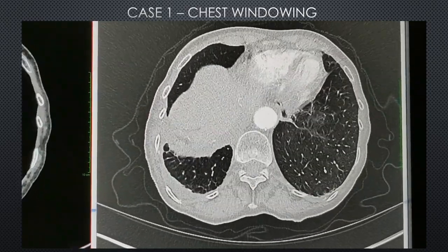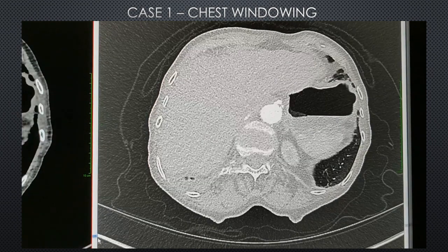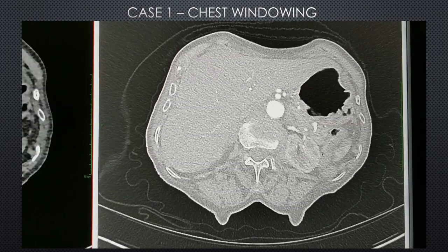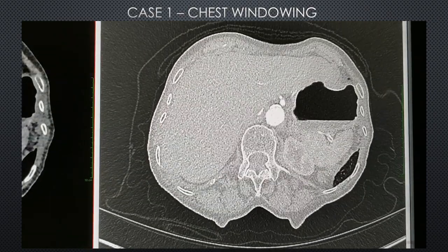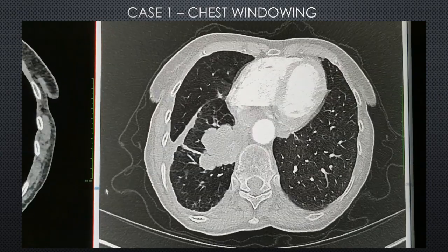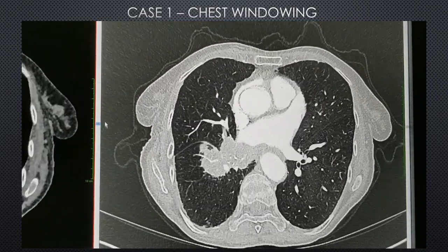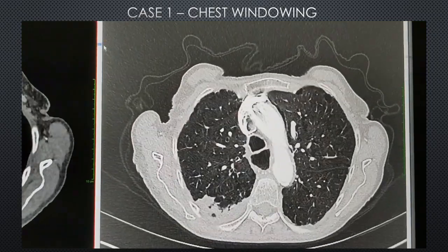This is the liver with contrast within it. That's normal looking. And then we're going back, and you can see the heart, so all the contrast within the heart is shown here, and the pulmonary trunk, etc.